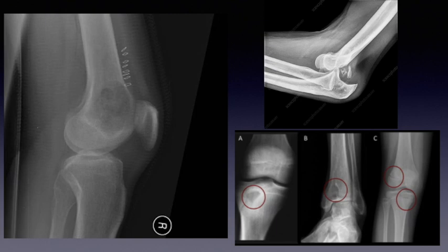Hello everybody and welcome to our recap video in which we will be approaching the musculoskeletal X-ray from different points of view, in which we will learn more about how to read it and make the differential diagnosis. You will learn more about the different types of diseases you can find in any musculoskeletal X-ray.